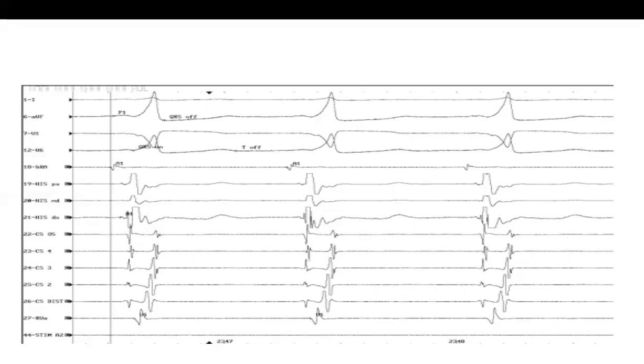One question, Ahmed? Yes, please. You said you should fix the catheter position in the CS if the V is bigger than the A. What if the position is not the cause? What other pathological explanation do we have? No, this is the only explanation. If you put your catheter in a proper way, you don't get this big V.